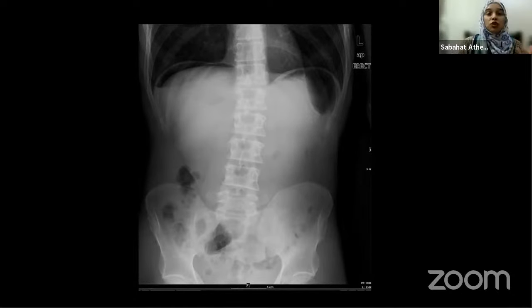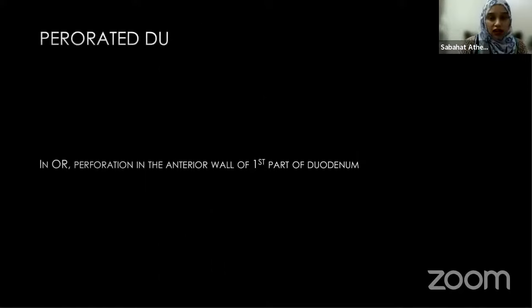And you know, these are one of those moments when you really feel happy with the surgery on call and the ED, because they are taking decisions on the patient history, on their own examination, and on the X-ray. So this patient was taken to the OR, and it was a case of duodenal perforation because he had gastritis. He was a known case of gastric ulcers. So these are one type of X-rays, EDs, and on-call cases you have.